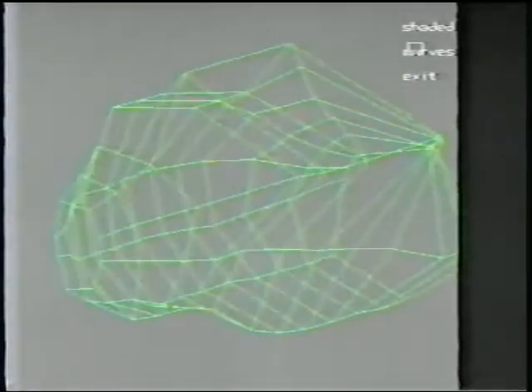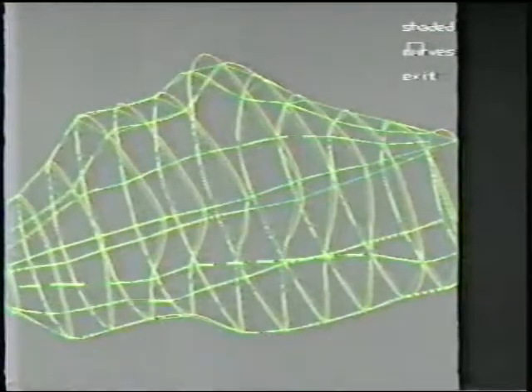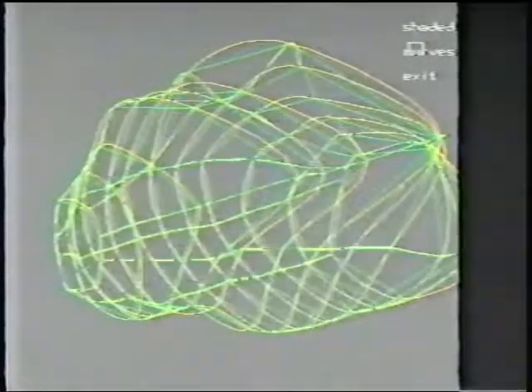Now let's take a look at what we've done after extracting some contours of one element of that set of slices. Here you can see an outline of it. Now we can fit a bicubic patch surface through that outline. This is an interpolating bicubic spline function. Again, all the transformations, the bicubic spline functions, etc., are carried out locally in the Adage 3000 display system. And of course, we provide high-quality image rendering of this spline surface.